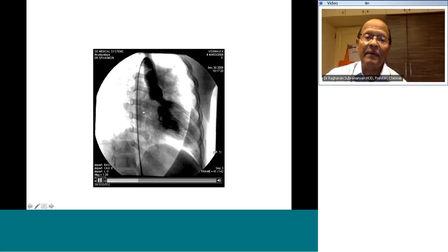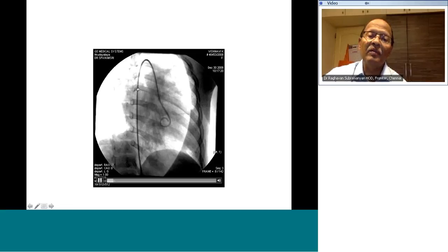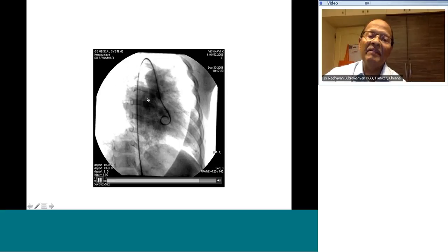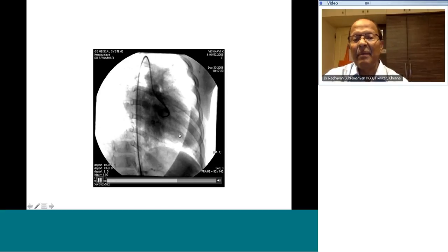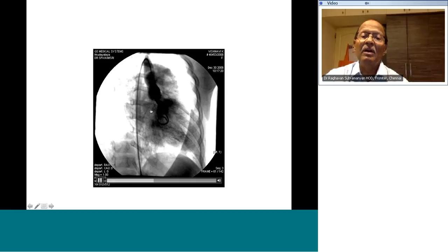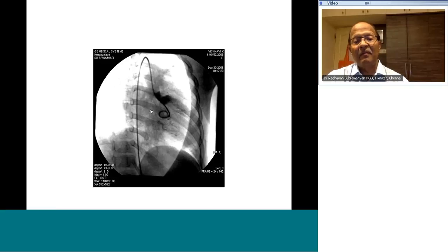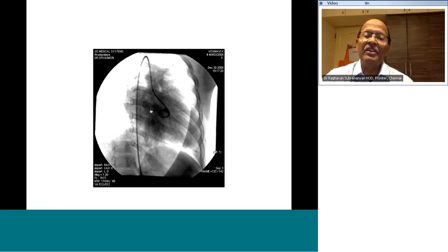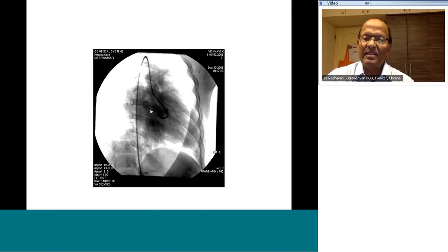Now, when it comes back to the atrium, you see only one atrial mass filling. You don't see an LA filling separately and RA filling, and then RA filling through the ASD. Therefore, very commonly they have a large primum ASD, and you cannot differentiate LA and RA. So this angiogram you must actually describe as evidence of complete AV canal defect, indicating a large intra-atrial communication and a large interventricular communication, no mitral regurgitation.